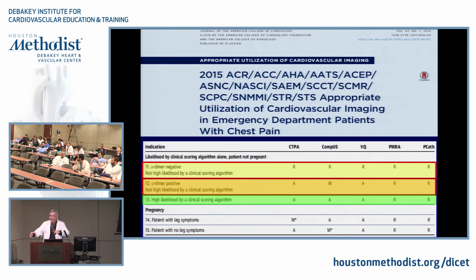Yeah, we see that with the DE. It just sits there. Everything else moves all over the place, but the descending thoracic, that's actually a board question, incidentally, just in case any of you take boards. But we're CT. But yeah, I mean, the ascending thoracic aorta, the arch, they all kind of go crazy. But the descending thoracic aorta, once you get back along the spine, forget it. It's immobile. You know, it just sits there.